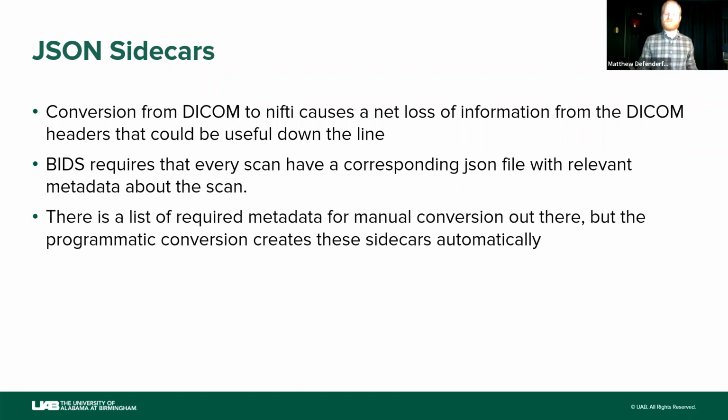There is a list of required metadata for manual conversion out there, but I'm not going to link that because one, I don't know where it is, and two, going and manually extracting metadata from the DICOM headers to store in the JSON files is a huge pain, and I would not suggest anybody do it, even for practice or anything like that. It's just a huge time sink that can better be done using the automatic conversion tools that I'm going to show you later. Okay.